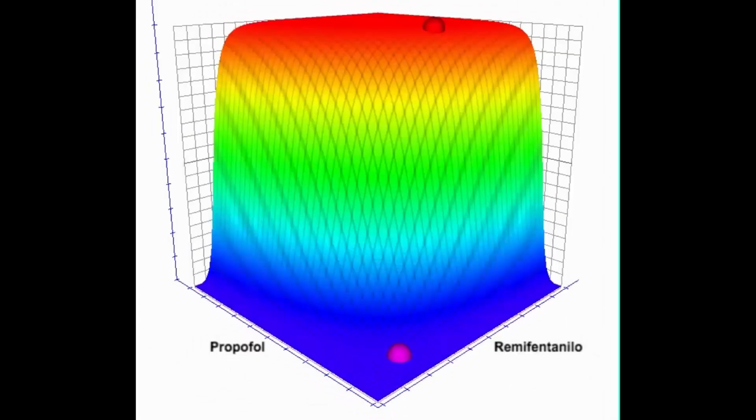Tacan 3D is the first 3D software that incorporates the surface model and allows its interface to handle the concept of space as a function of time, allowing to modify the PNR and the time to reach said PNR. For Tacan 3D, the PNR is the objective to be achieved in a stipulated time, and this PNR will be modified according to the variables of hypnosis, pain, and the adjuvant drugs administered. Tacan 3D is the first software that allows visualizing in which spectrum of the surface model the patient is navigating.